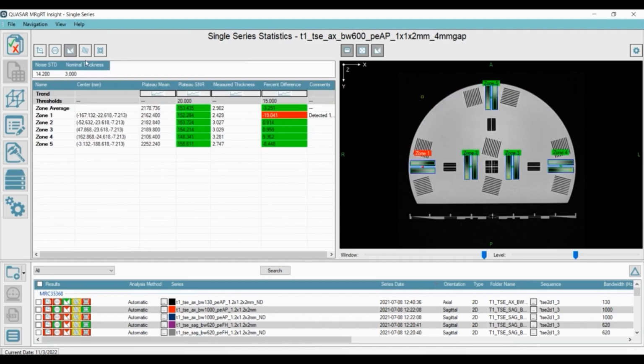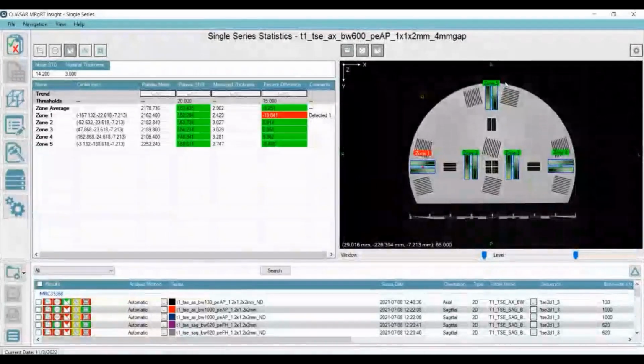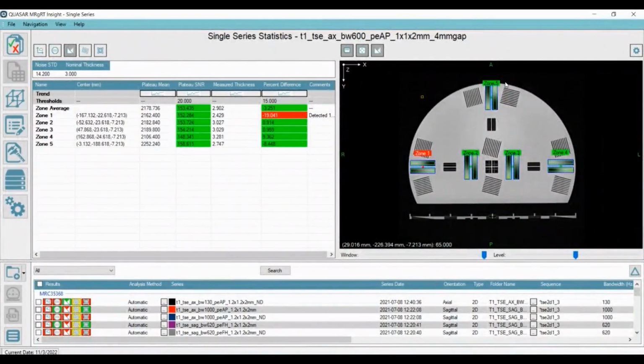Next up, we have our slice thickness measurements. Within the phantom, there are 10 of these slice thickness ramp widgets that are used to calculate the slice thickness. The ramps are scattered around the phantom in both the upright as well as the coronal baseplate, and they can be used to denote and measure where the gray values fall off the ramp.